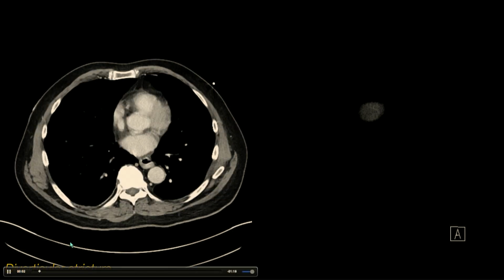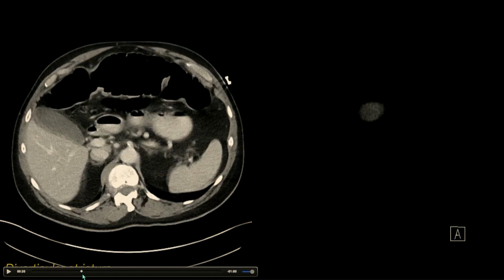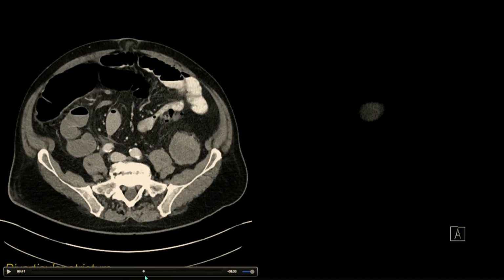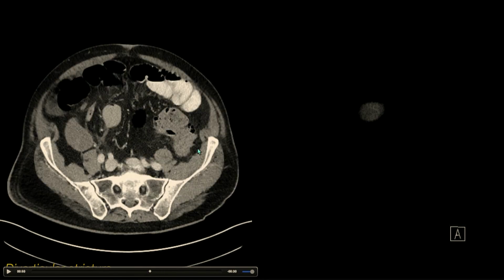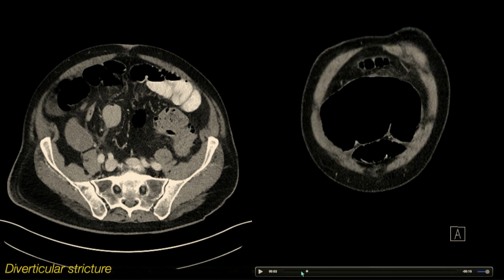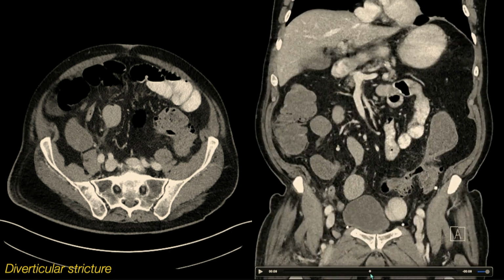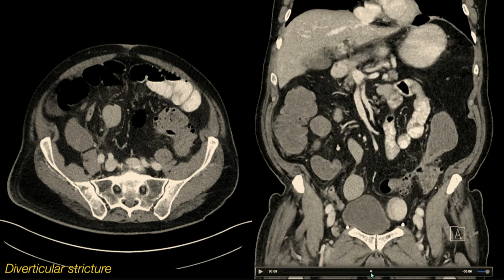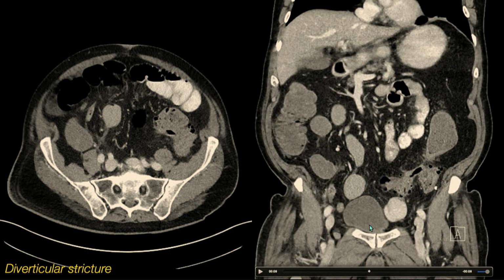All right, we can wrap up here with touching on a diverticular stricture. So a couple other complications. Here we have a large bowel obstruction, and resulting in this focal narrowing here was a chronic diverticular stricture. Usually you're not going to be seeing a lot of shouldering or abnormal apple core appearance, but this diverticular stricture actually formed this little bridging communication where there's a colocolonic fistula to bypass it.